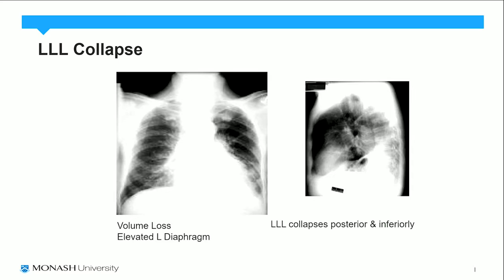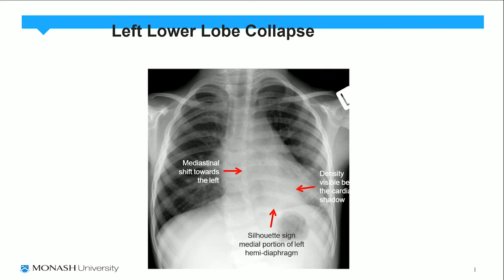With left lower lobe collapse, there's volume loss, and also an elevated left diaphragm.